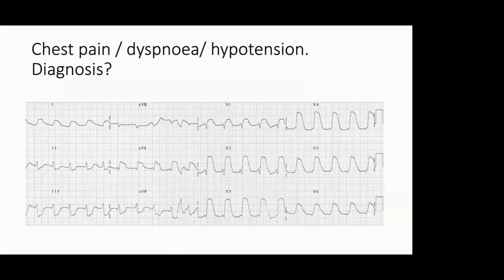So the final thing, the diagnosis, just a diagnosis only. Where? Anterior MI. Anterior MI. What will be the prognosis? This acute occlusion, this tombstoning like ST elevation. So this patient needs emergency revascularization. He will be in shock. This will be like tombstone like ST elevation, very huge ST elevation. It's anterior MI. Oh, I think we completed today's ECG.